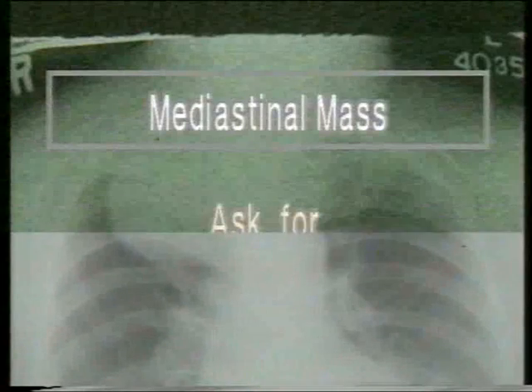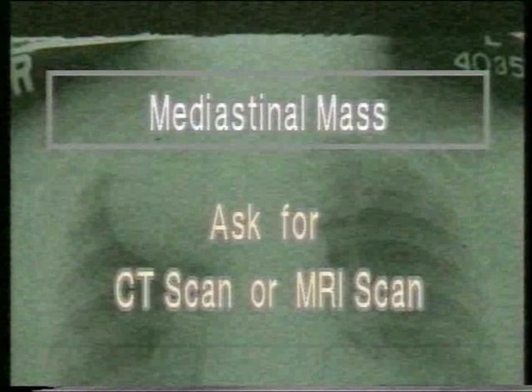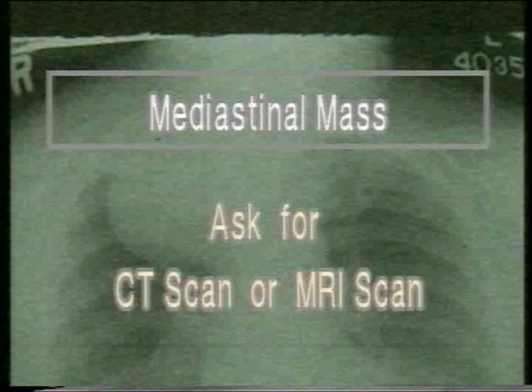Note this mass in the upper third of the anterior mediastinum on the right side. It could be a lymph node mass or a thymus or a retrosternal goiter. You cannot give a definite diagnosis. Remember that mediastinal masses are visualized much better and diagnosed more accurately on a CT scan or MRI scan, and that is the investigation of choice once a mediastinal mass is diagnosed on a plain X-ray.